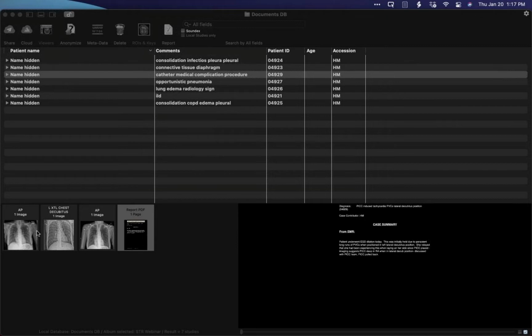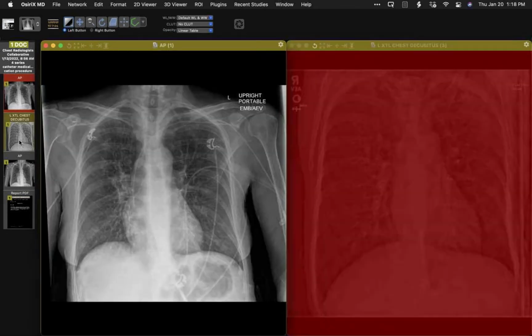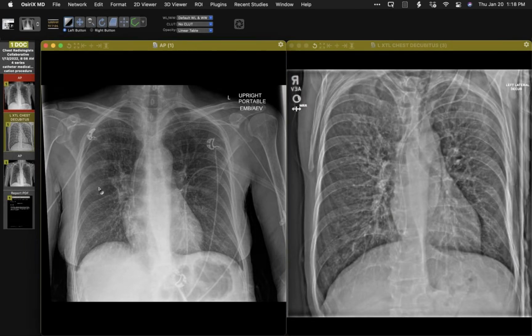All right, you're definitely going to like this case. So here is a patient that has a PICC. Then I was presented with this to read. And the order was associated with exactly what you see. It said, evaluate PICC, place patient in the lateral decubitus position, left side down, and you can see the patient's arm is abducted. So I thought, that is curious.